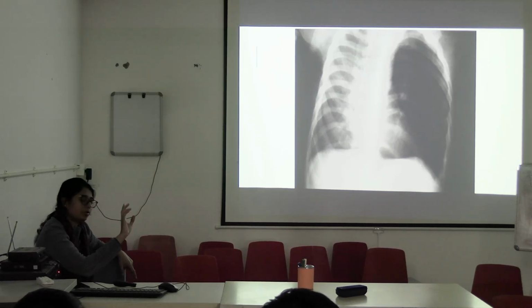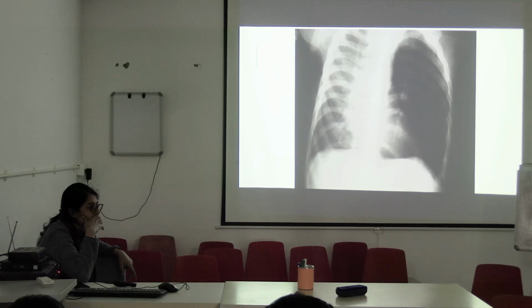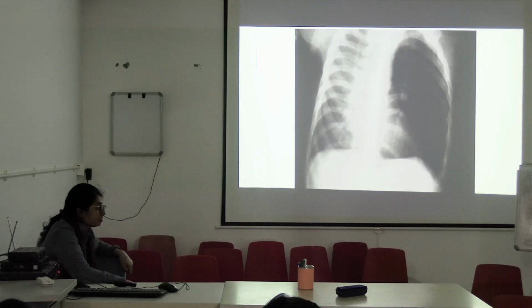Okay, view then, হার্টটাও তো শিফট হয়েছে দেখ, so there is mediastinal shift to the right.